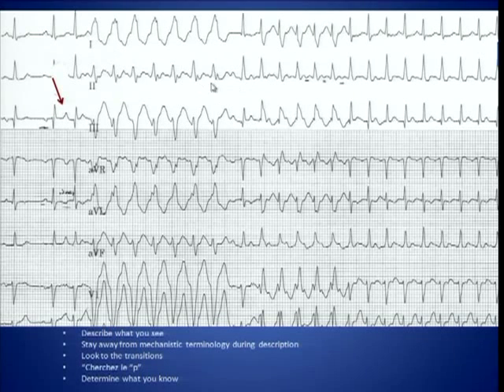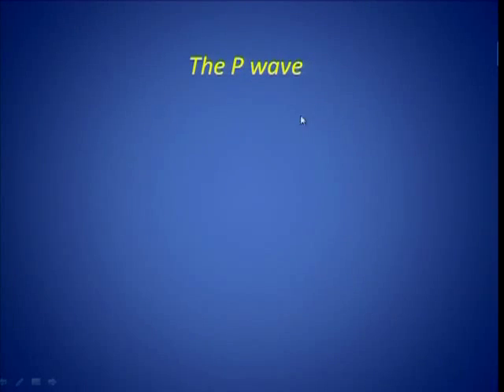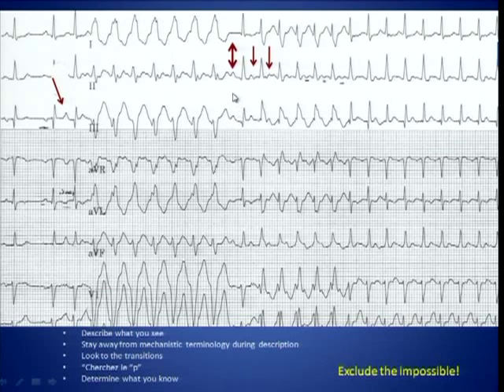And now when I do my measuring backwards, I can figure out that this, and even this, are a P wave. Well, here I actually have the end of a P wave, two P waves in a row. So this must be an atrial tachycardia. I look for those P waves. I now map out the rest, and I can actually see them there. This is an atrial tachycardia, which manifests itself after pauses as both narrow QRS, right bundle, and left bundle tachycardia. It must be atrial tachycardia. There's nothing else it can be.